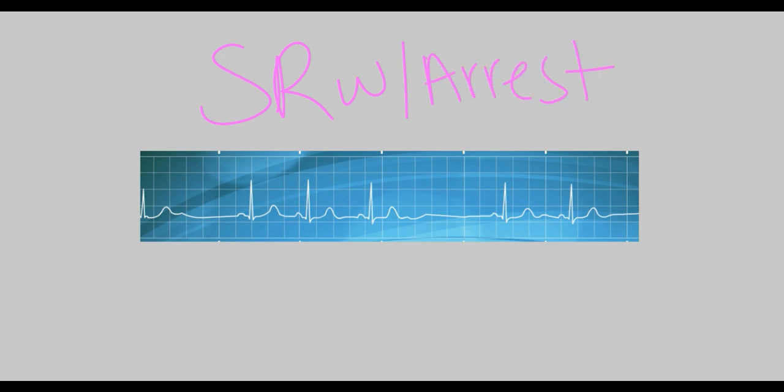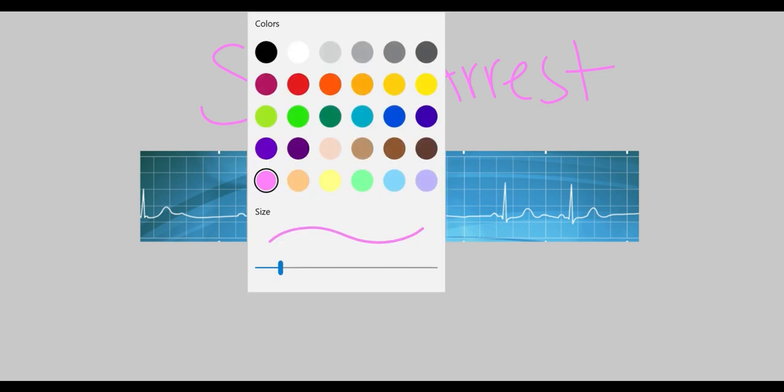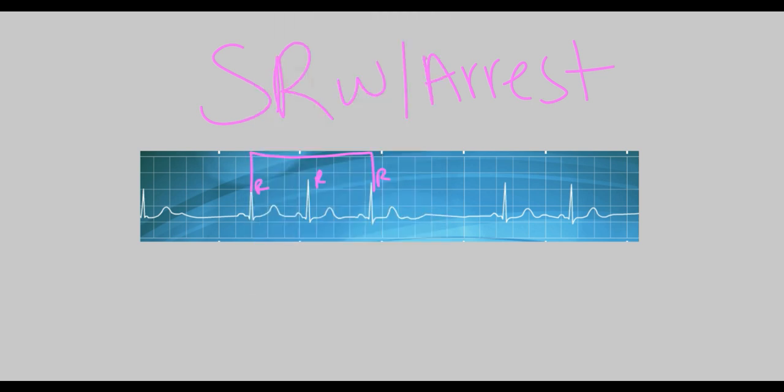Remember that with arrest, we would measure here. Just like the exit block, we're measuring 2 consecutive R to R, and whatever we get here, we're going to see if it matches up to this one.